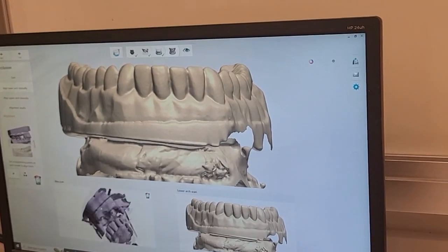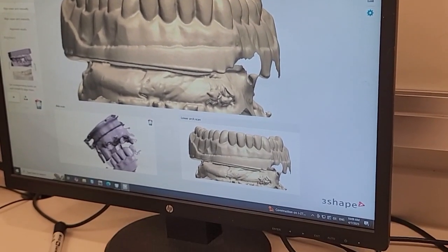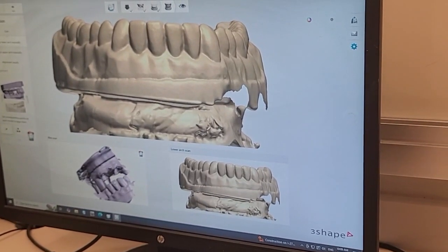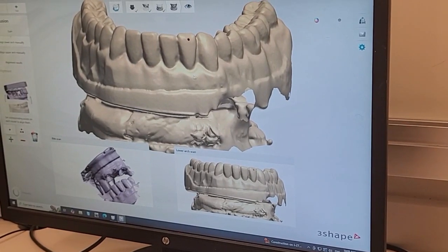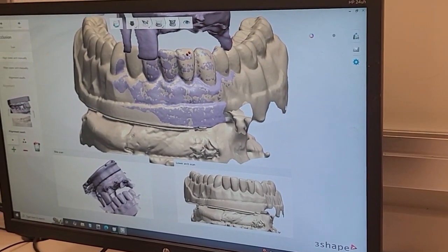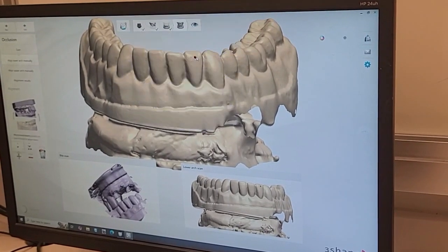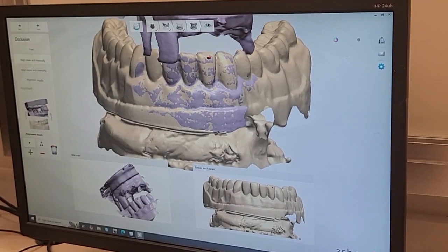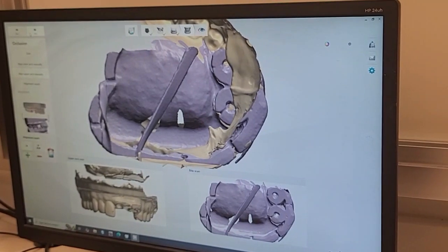So again, I'm gonna look for a landmark, and we're gonna give it a try. So let's say I'm using this, and I'll find it here. Let's see if it works. It works. Again, you see those points that are a little bit further? I can leave it like this, it's not a big deal, but I can also bring them a little bit closer. Okay, so that looks a little better. So now I'll click next.